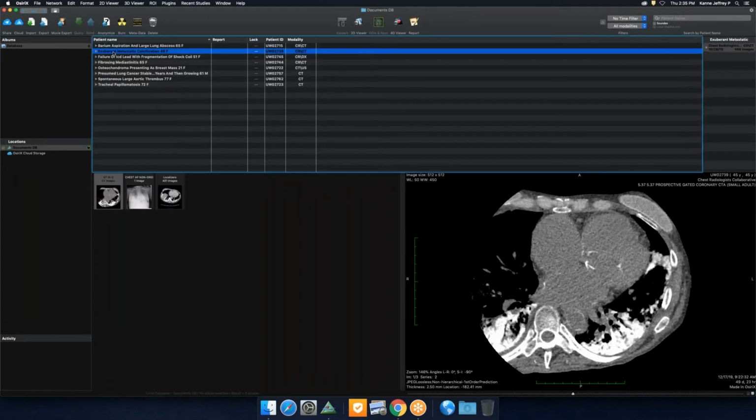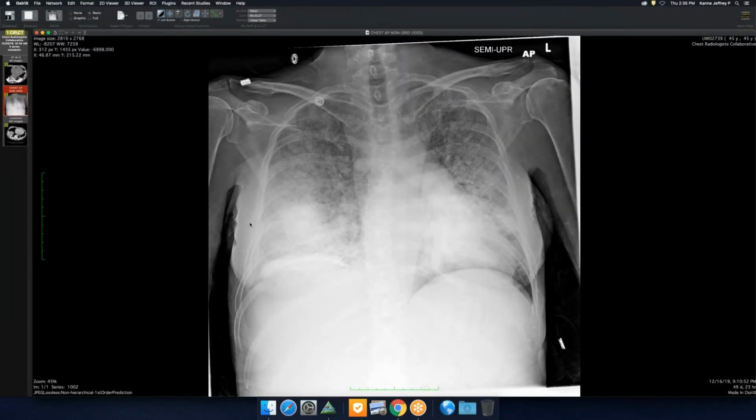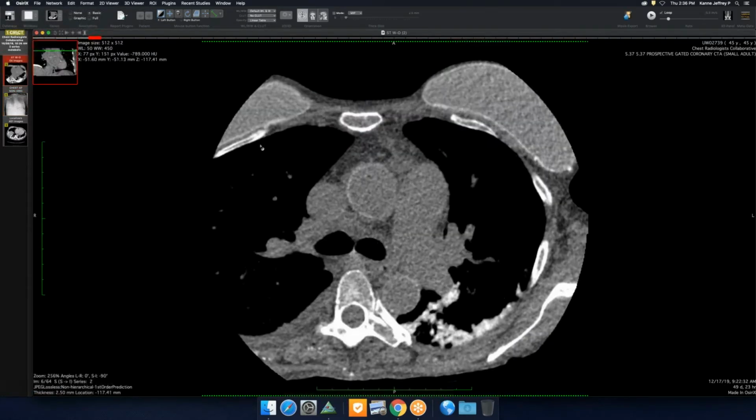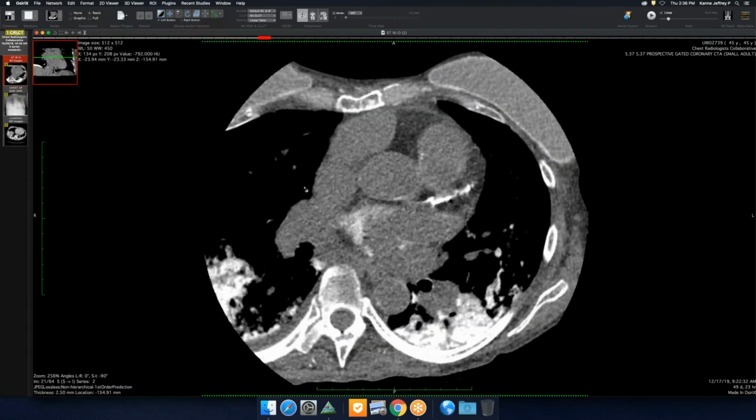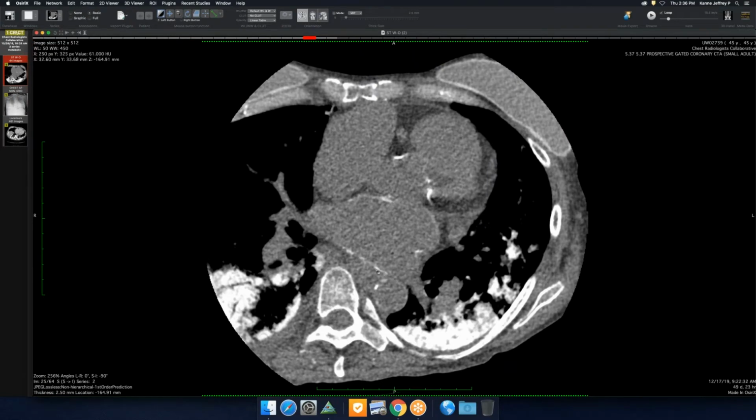All right, so here's another case of dense lungs, but this is even more exuberant. This is a patient with long-standing kidney failure, and you can see it almost looks like edema, but the lungs almost look too dense, and you get what looks like a plaque along the right hemidiaphragm and some pleural thickening. This was a portable, and then I have a cardiac CT, just a non-contrast, and you can see there's calcium in the wall of the left atrium.